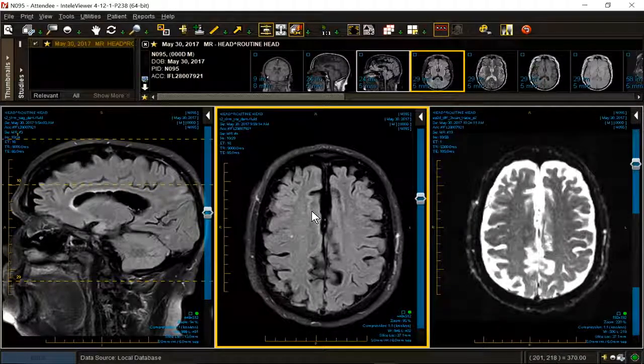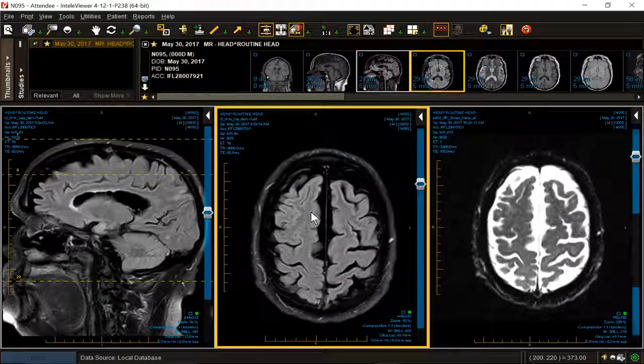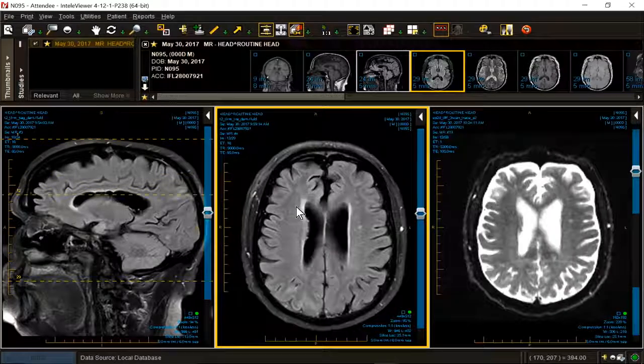We might describe these as small areas of punctate hyperintensity, which in a patient of this age, and I do not have her age, is it on the report? In a 74-year-old, most likely related to small vessel arteriopathy, venopathy, hypertension, or metabolic syndromes.